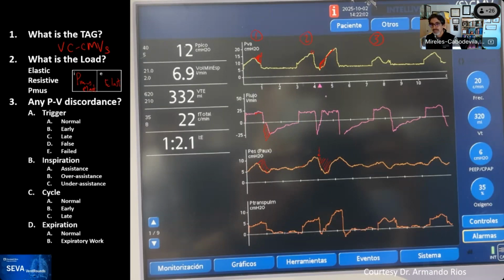And this is an area of controversy or of thought process as we are trying to put nomenclature on stuff, because essentially this didn't happen during inspiration, but it happened immediately after expiration. And so it's a source that, I mean, we have to come to terms. Yes, Ariel, as we mentioned, this is also known in the literature as reverse trigger. But this is useful also because I want you to observe what happens here.